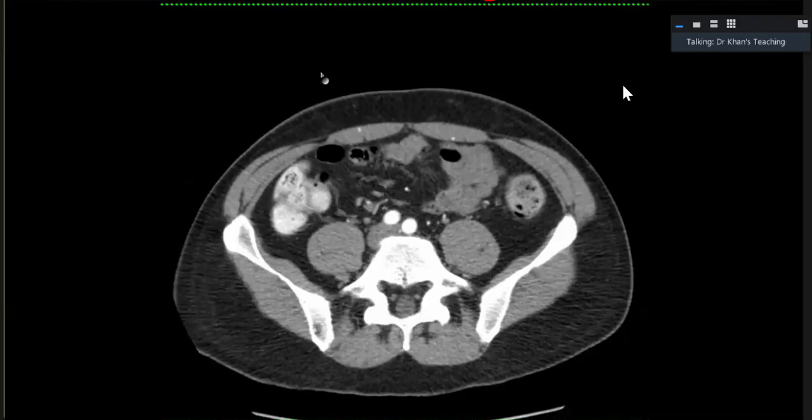So candidate 1, this is a 38-year-old male. The patient has presented with abdominal pain. Right now, the main problem is hematemesis. The patient also has hematuria. Over to you. Hematemesis as well as hematuria. Okay. Request remote control.